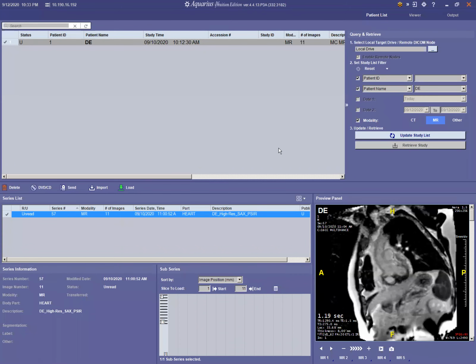In this video, we'll go over the percent LGE calculation on TeraRecon. So I pulled up the short axis stack of the PSIR over here. I'm going to load that to the Cardiac workflow.